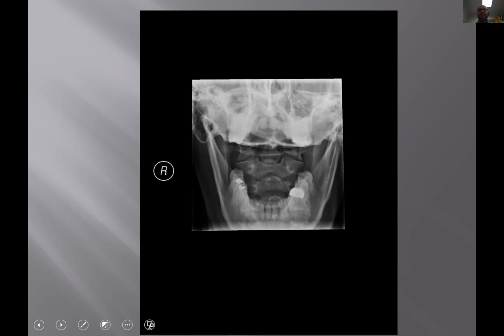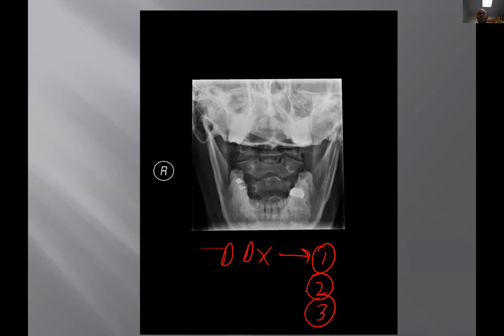All right, now let's think about finally, right? Because this is what we like to do, but I'm making everyone slow down to detect and describe. Now, differential diagnosis. Let's get three things here, or I'll get the list started. You guys start. Give me three things you think this could be. Non-union of odontoid. Of what? Non-union from a secondary ossification center. Okay, good. Secondary ossification center.